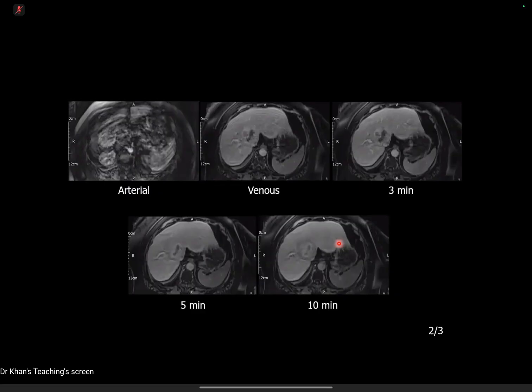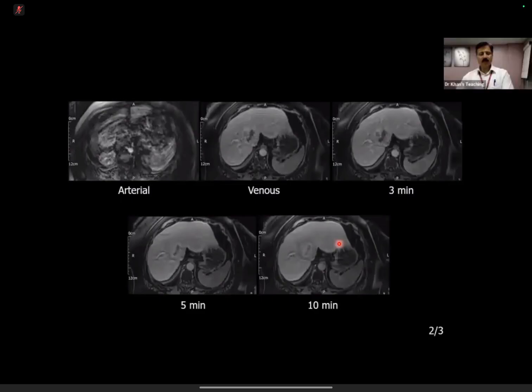I'm thinking of now hemangioma, because hemangioma can be diffusion restricted, and with this contrast enhancement pattern, hemangioma comes into my top differential here. Okay, but the point is that if you just see this periphery of the lesion, there is a central scar. Yeah. If you see the periphery of the lesion, it has shown washout, correct or not?